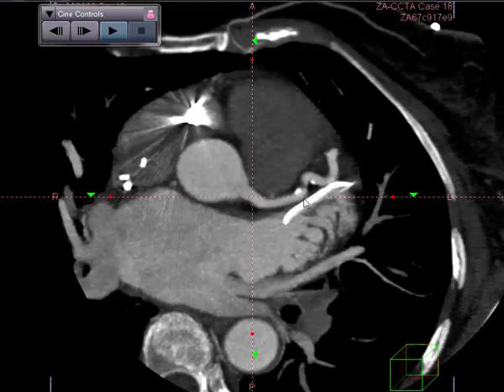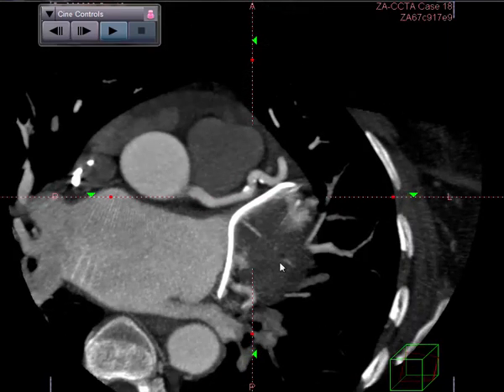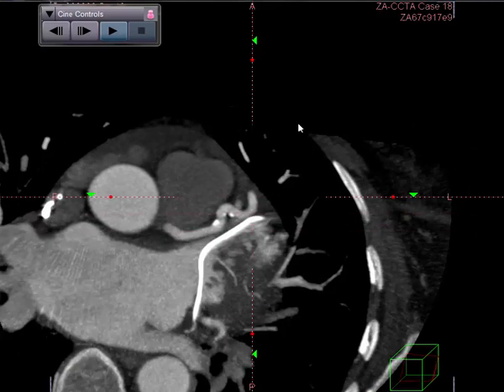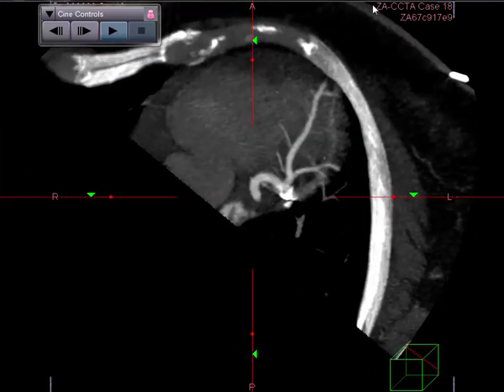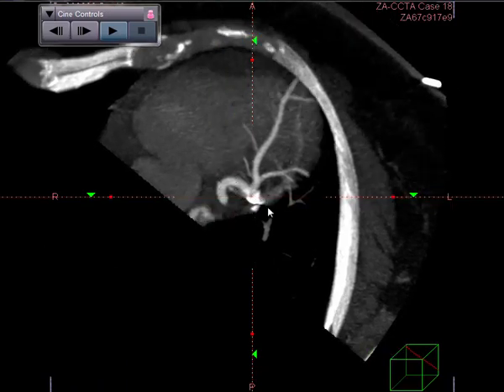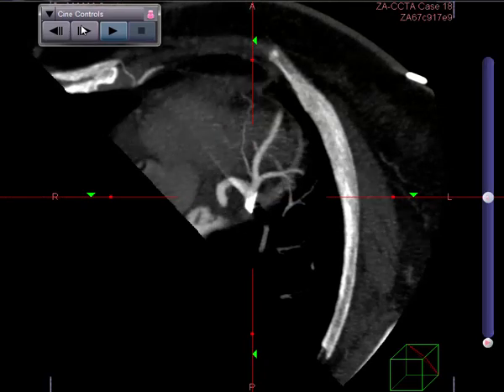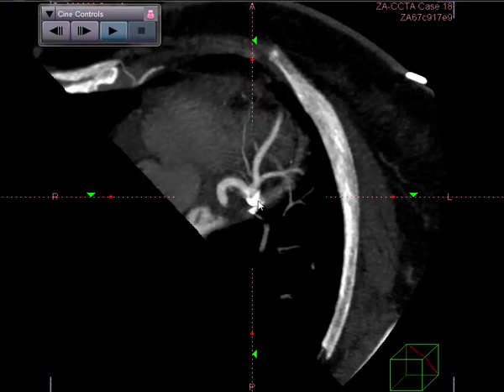Let's begin now by looking at the left anterior descending. You can clearly see some eccentric non-obstructive plaque involving the proximal portion of the left anterior descending. So we proceed down the remainder of the vessel. There is some more calcified plaque further down, a bit more difficult to evaluate in this region. Let's see if another phase will help. Difficult to evaluate whether any of these phases works.